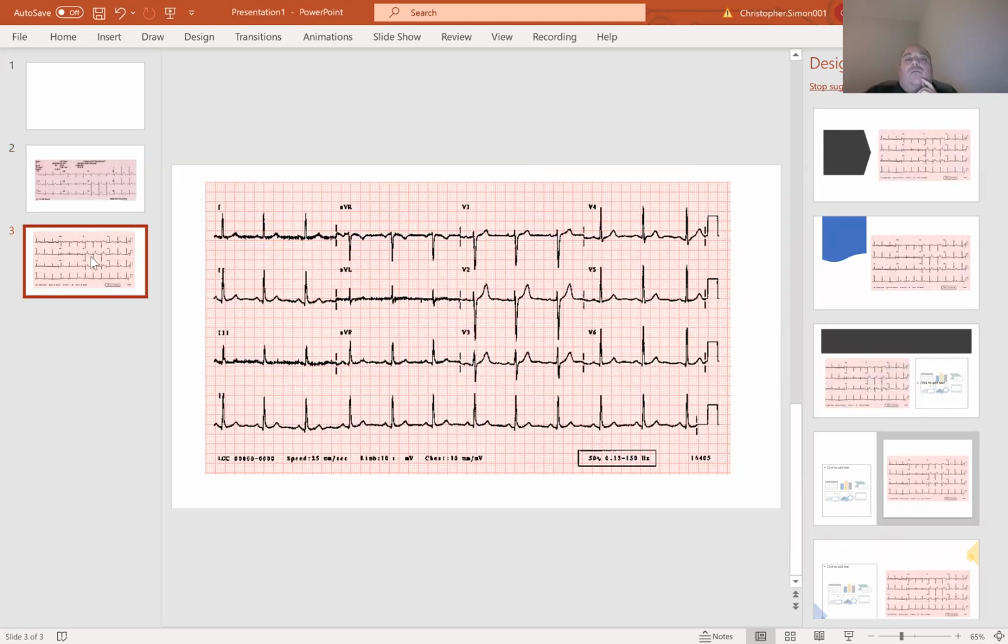So this has a little bit more artifact, is not as clear, but you'll notice there is like a fourth line on the bottom, whereas the other one only had 3 lines. Okay, well, let's see what's going on here. This is more common in a hospital-based machine, and these are actually a little bit better. At least I like them a little bit better, because you'll notice that you have your groupings here.